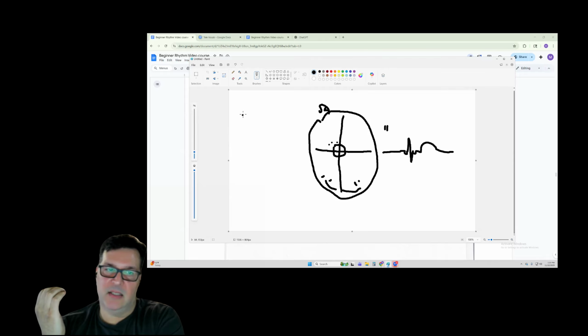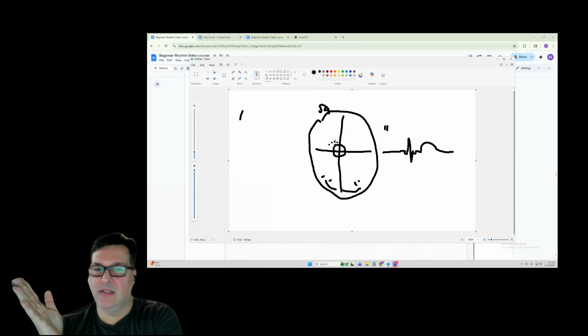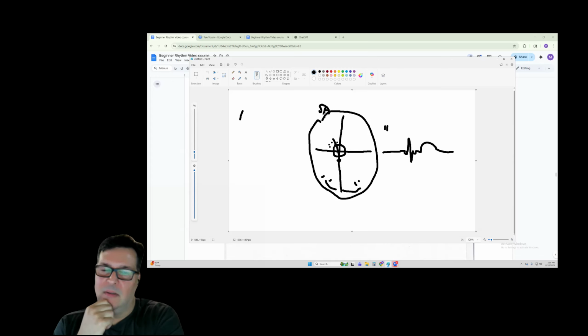If it's not less than 0.12, it's coming from up here, or if it's positive and less than 0.12, either way, if it doesn't fit those two criteria, it's going to be an atrial ectopic, someplace close to the junctional area. Okay. Got it. You okay with that, Kristen? Yep, good.